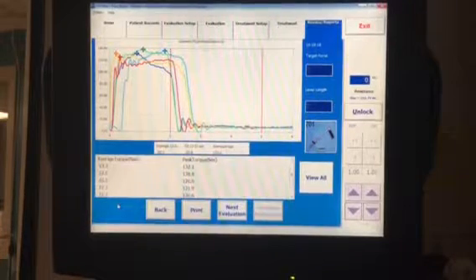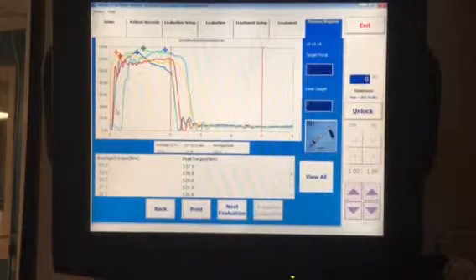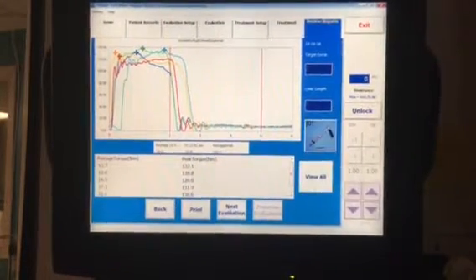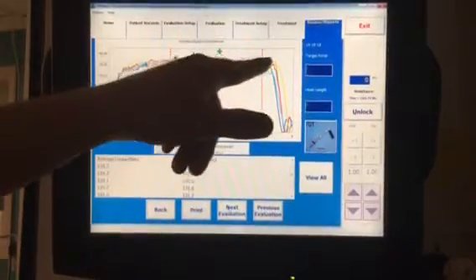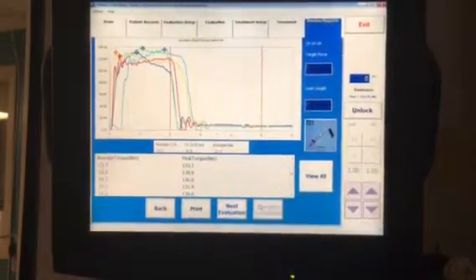Now you're going to see the 4 different graphs. Some of these are going to be rate of force development, and some of them are going to be the actual strength tests. You'll be able to differentiate them because the rate of force development will look like this. They end only after a 2-second contraction, whereas if we go to the next evaluation, you can tell that that's a strength graph because it goes all the way across the 5-second duration of hold time. So let's go back to the rate of force development.